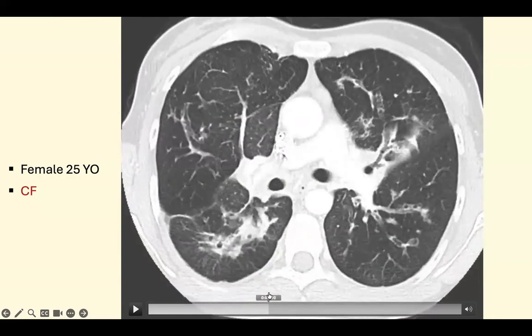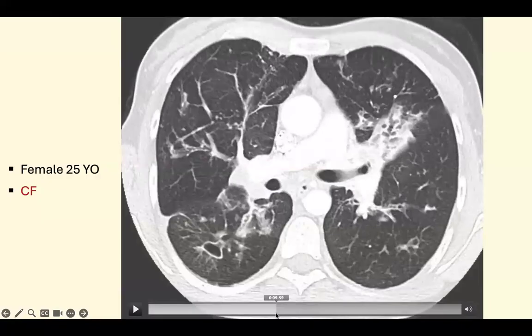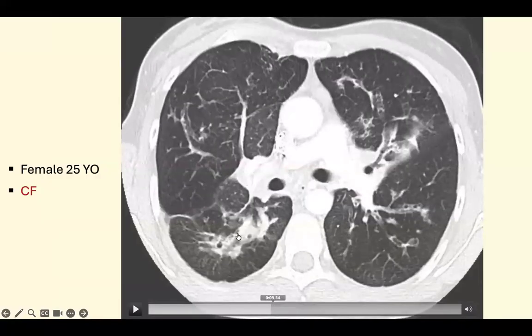In this example, see the bronchus, here it's patent. Then it is opacified. It is now mucus plugged. See the continuity of it. So this started to show some air in the tubular structure, which is blocked here, obliterated here by the mucus. These are mucus plugging.